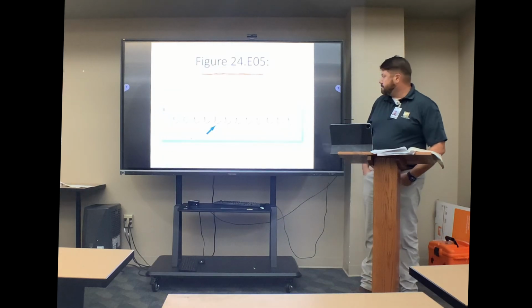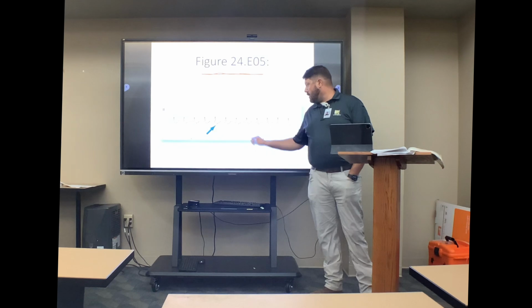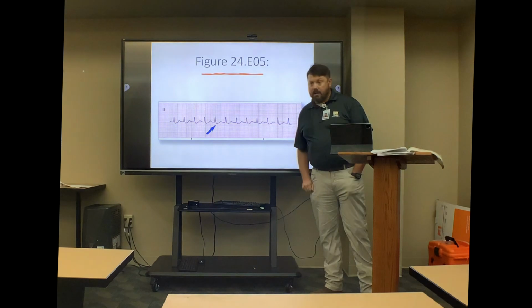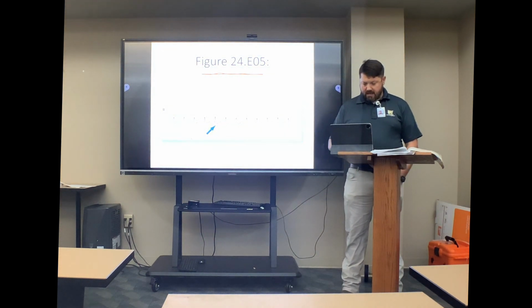Same thing here. You got that pseudo S wave, got a rate of 120. T waves are exact. QRSs look very similar. So you got a junctional tach.